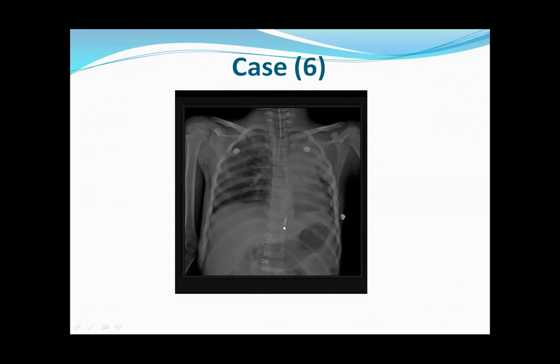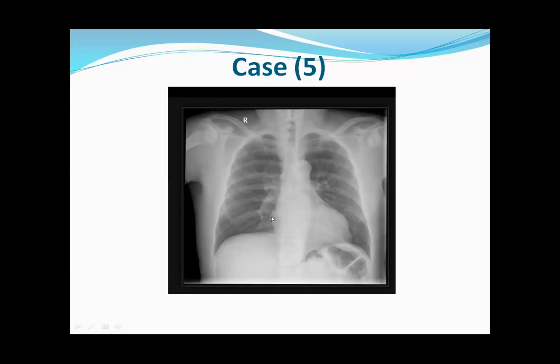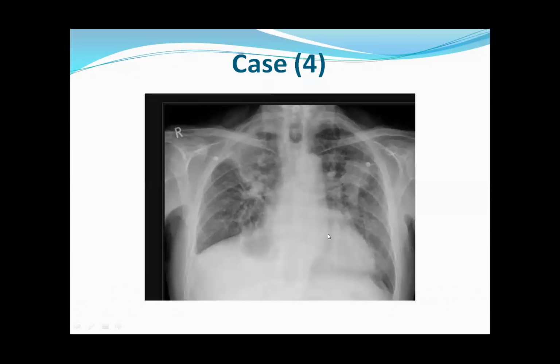Also you see this one. This one you should pick up quickly, the avascular necrosis in the humeral head, because it's very clear. Also, the H-shaped appearance of the vertebral body suggests sickle cell disease. In the management, you should do hemoglobin electrophoresis. Also, I should do an ultrasound to assess gallbladder stones and spleen, and compare with any previous image.